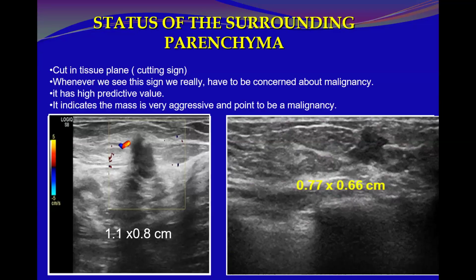centimeter. I have a 3 by 4 millimeter lesion on screening imaging. It was a subtle distortion on mammography. Corresponding ultrasound demonstrated a 4 by 5 millimeter non-palpable mass. Okay, it was oval at the beginning.